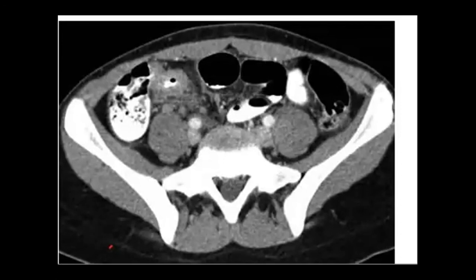If this patient is immunocompromised and you suspect something called typhlitis, that can also be a good differential. But in this case, this is a 30 years old female patient with right iliac fossa pain, so she doesn't have any history of chemotherapy or immunocompromise or something like this. So until now, you can put at the top of the differential inflammatory bowel disease.